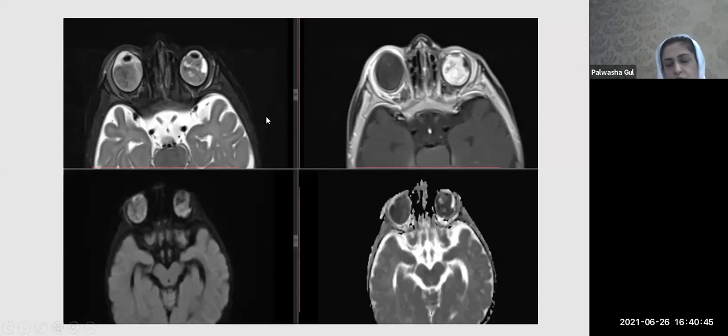So this was actually retinoblastoma. The textbooks would tell you retinoblastoma is avidly enhancing, heterogeneously enhancing, etc. But I've never read, even on my Radiopaedia website, of a retinoblastoma which is non-enhancing. We thought maybe it has grown so swiftly that it has lost its blood supply, and that is the reason it's not showing contrast enhancement.